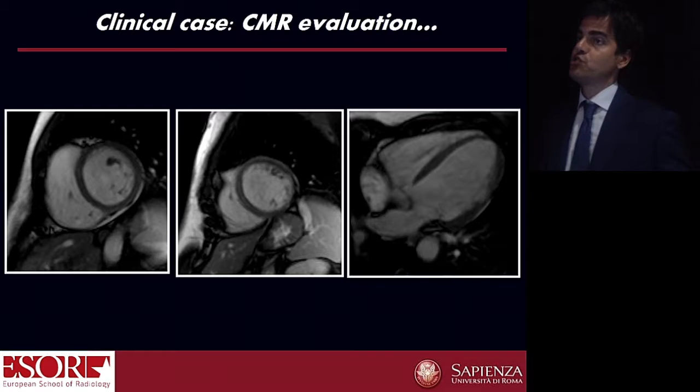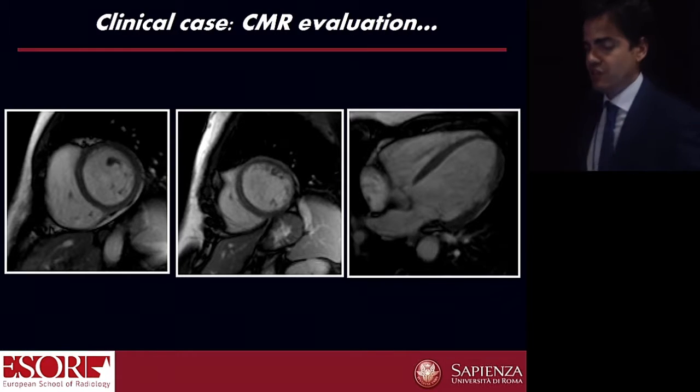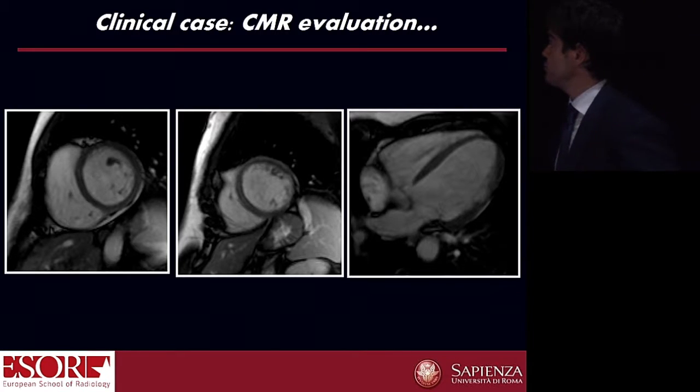So considering myocardial function, it is a normal myocardial function. But also match it with T2 STIR, third line, and with late enhancement, second line, at different levels.